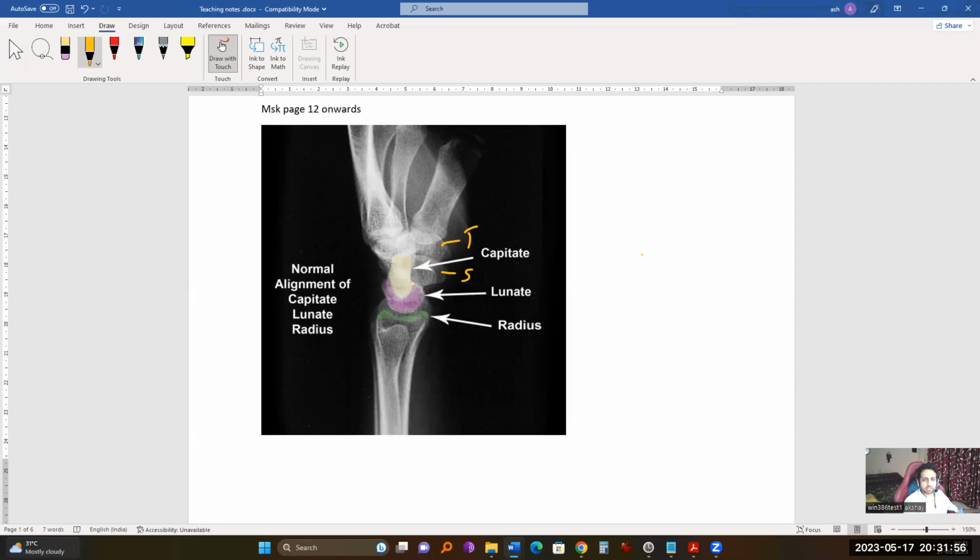Then behind this scaphoid, there's a large bone. You can see it over here. Actually, it is quite larger than this. I don't know why it looks a little small over here. Anyway, that is the capitate. Then the next bone is the lunate, which is shaped like a moon, and it will be in contact with the distal part of the radius. And the pisiform bone you'll see within the scaphoid. You can see the margin over here. So these are the important bones that you need to remember. Only these much. If you are interested, you can also learn the hamate. It will be somewhere over here.